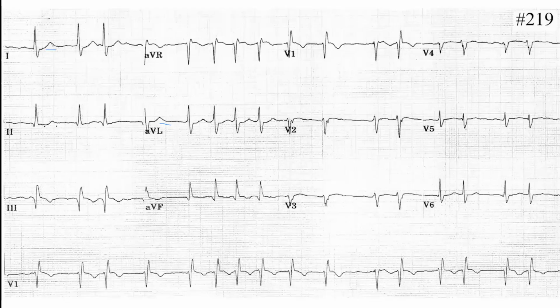Now that's a difficult ECG. Okay, now who? I don't know whether Sunji? Yes. Okay, your turn.